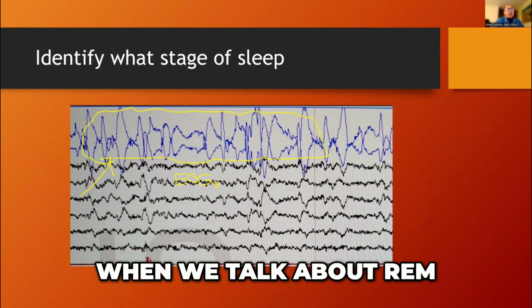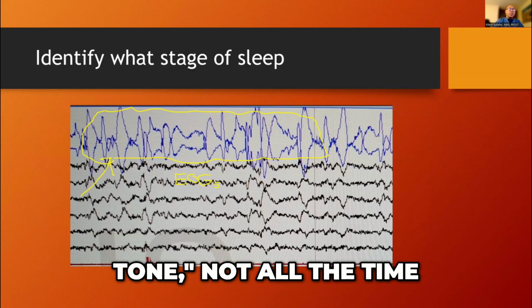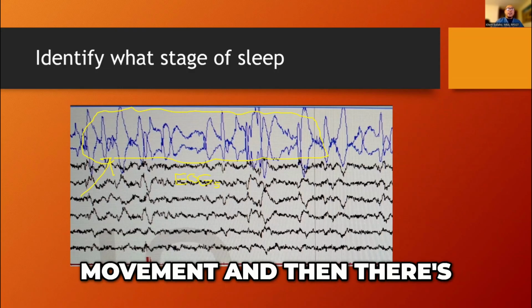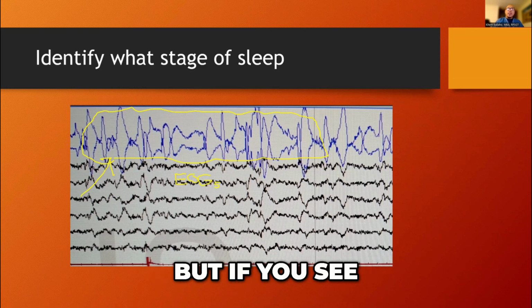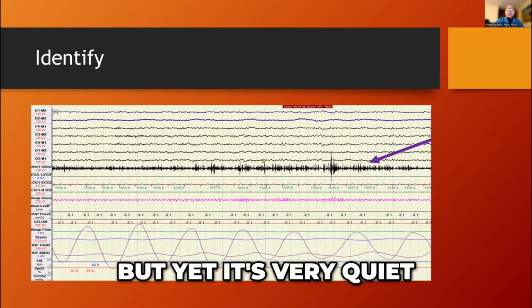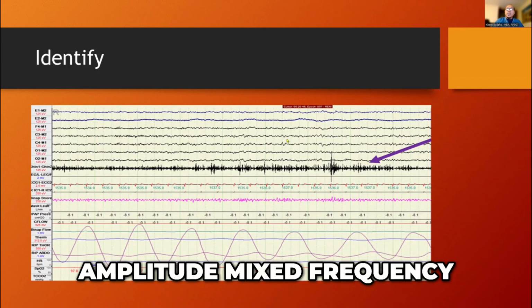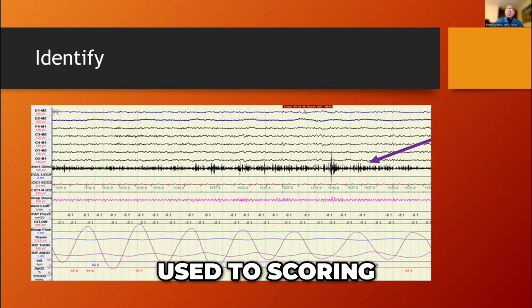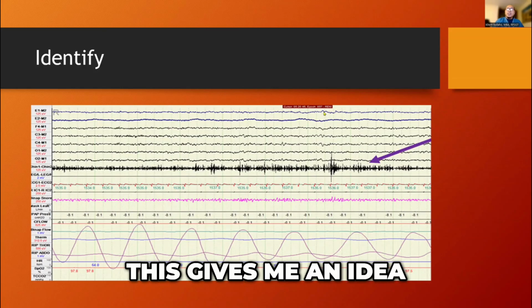When we talk about REM, we usually say I know it's REM because there's no muscle tone, but not all the time. So just to be clear, when you see eye movement and then there's no muscle tone, that's phasic REM. But if you see very little eye movement and then there's increased muscle tone, but yet it's very quiet, this is all low amplitude mixed frequency. Very difficult. The only thing is that when you get used to scoring, you're going to be very sensitive to little fluctuations like this. This gives me an idea.